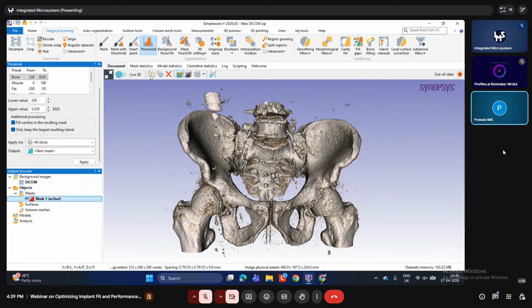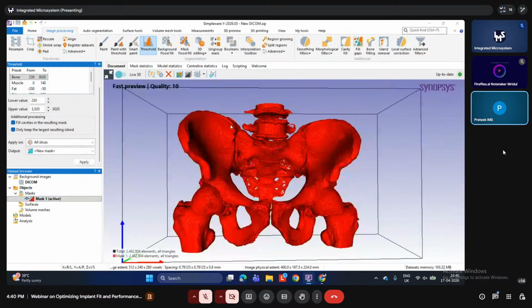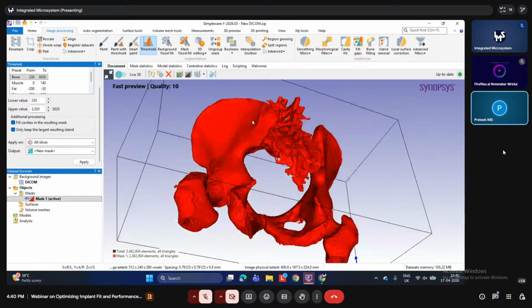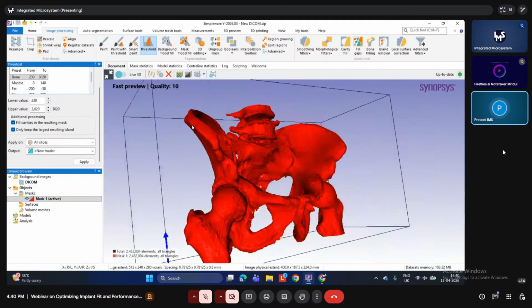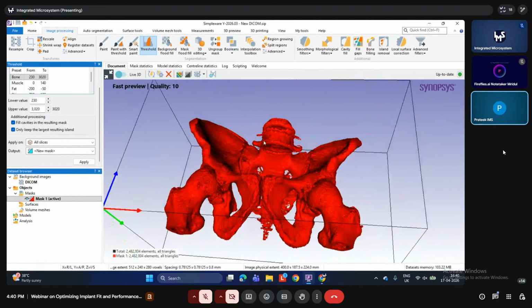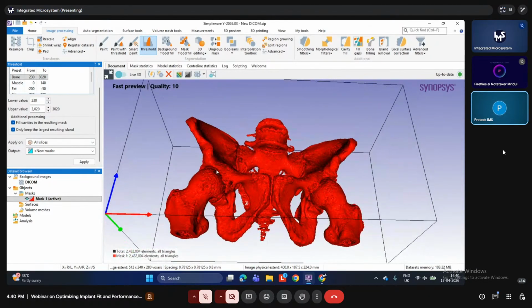After it, I'll click on this. This option is the generate a fast preview option. As you can see, it has removed all the artifacts and all the noise, and only kept the largest resulting element, that is this one. Currently, it is also available in various parts, but it is one unit.